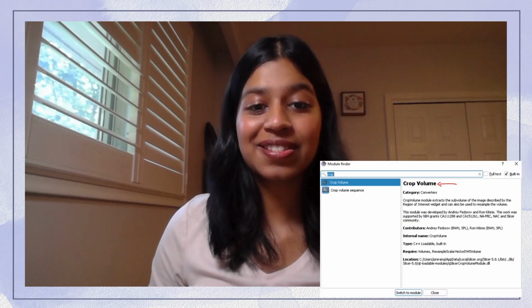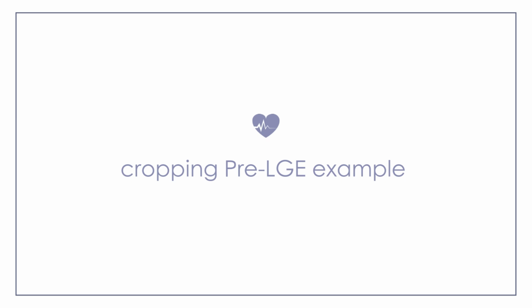To improve the results of registration, one of the methods that helped us was cropping. In 3D Slicer, you can use the crop volume module to crop the different images you are working with to focus in on key features or anatomical structures. Without the cropping, for us, the registration results were kind of dominated by the chest wall, the white representation, instead of the heart. So the crop volume helped us navigate this issue.